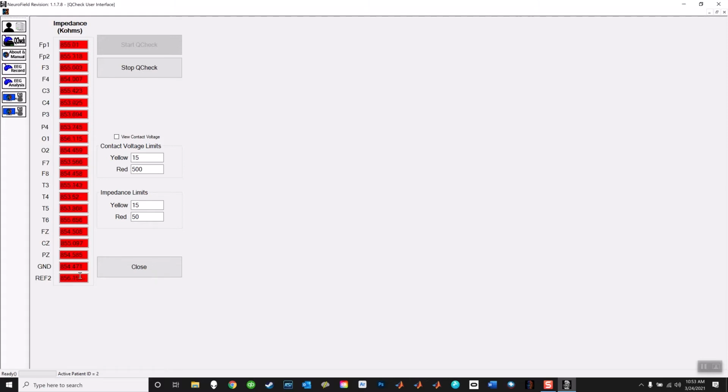Now, the last thing you should know about this widget is you can actually change these numbers and make it respond differently. So if I want to, I can make the values different for red and for green and for yellow. And that kind of helps you to narrow down if you're getting close to the number that you're looking for when you're setting a person up.